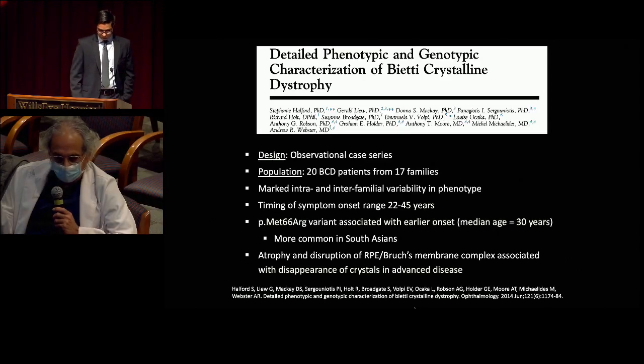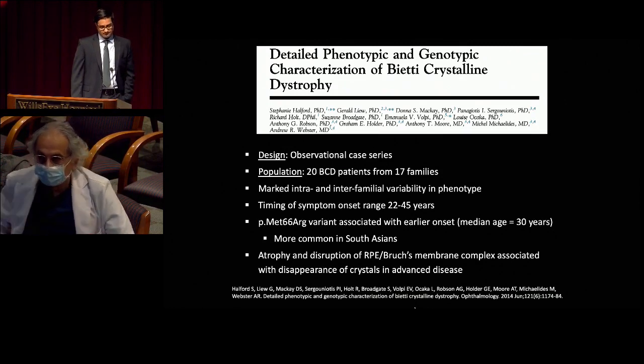I think it's also important that these crystals go away with time, and they disappear as more atrophy occurs. So they're harder to find in older patients, in their 30s and 40s, as the atrophy worsens. You look very carefully for them, and the perilimbal crystals also decrease. So it was really nice to see these beautiful pictures in a younger patient. Thank you.